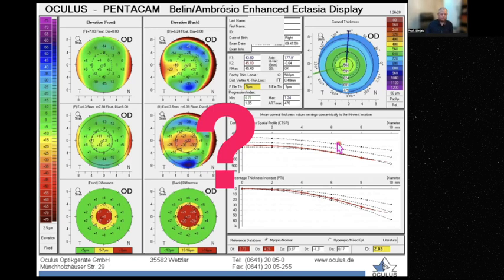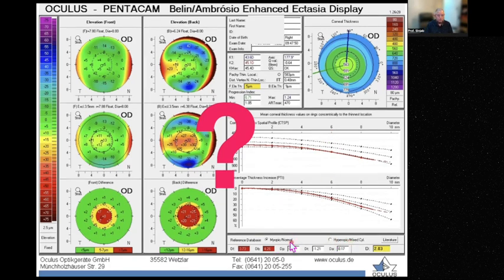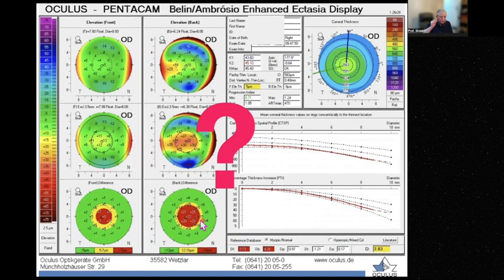No. Indeed, the patient has hypermetropia, while here it is clicked as myopia. So we cannot depend on these numbers. We have to click on the hypermetropia and check whether they are still there or not. In many cases, when there is mild distortion, it will disappear when you choose the correct one. But whenever it's severe, you will find it, maybe the change will be just minor.